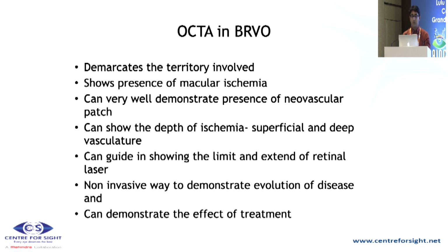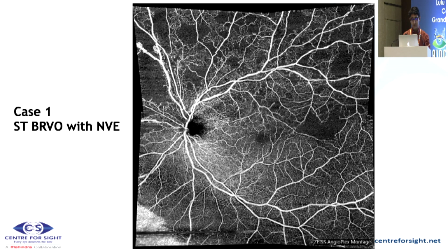And even if you want to laser those sectors for a BRVO, the montage will give you an area where you can actually laser. It's completely non-invasive, and you can even follow up the patient post-treatment on OCTA. So this is the first case which I'll show you. It's a supratemporal BRVO.